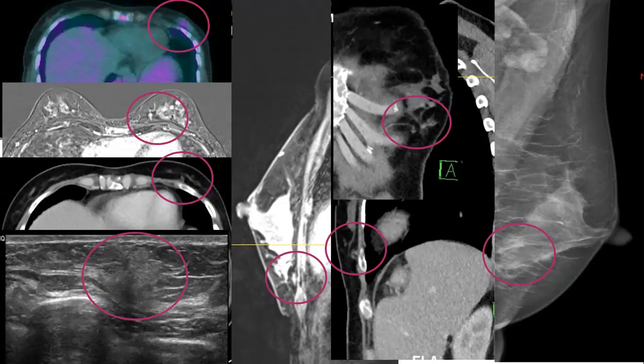Okay, so the take-home message, I will leave it for you in this case. Any suggestion for a take-home message or take-home point? Tell me what you have learned from this case. Always don't ignore even small breast lesions. Yes. We have to be patient.